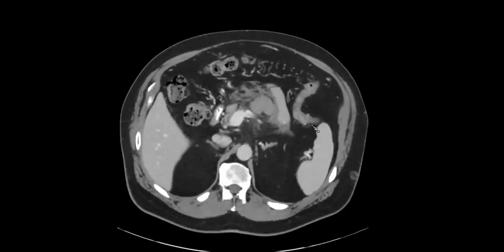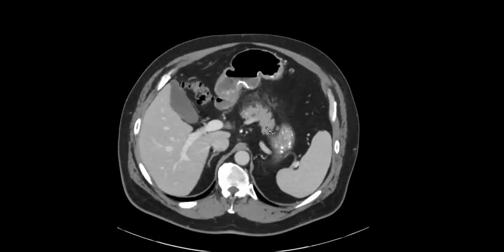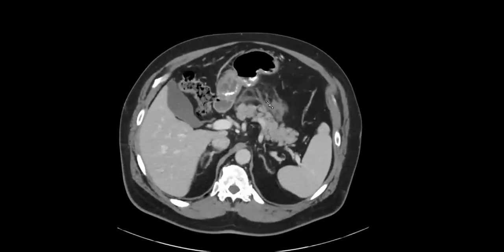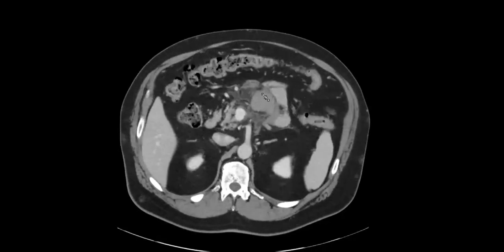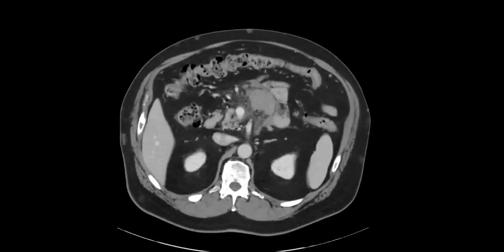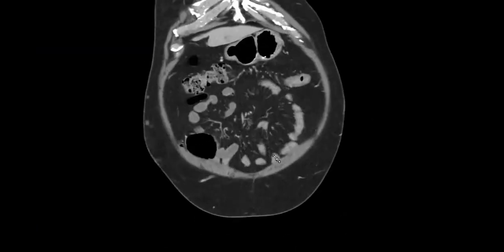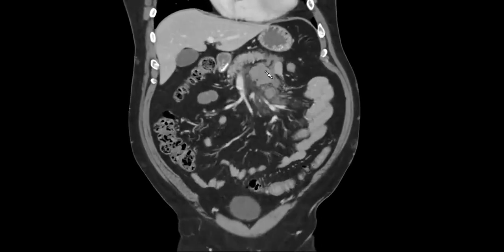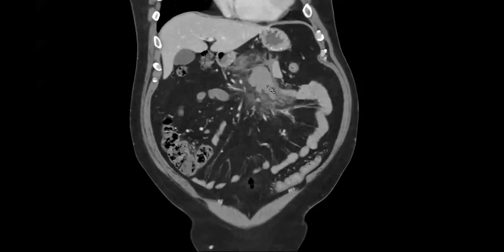Another thought we had was that it's near the pancreas. So is this pancreatitis? But it seemed pretty separate. And then what is this big, more mass-like thing? The other thing that we thought about was a hematoma. If you look here, a lot of this looks like blood. And this part, even though it's mimicking a mass, could just be a hematoma. So we got an MR.